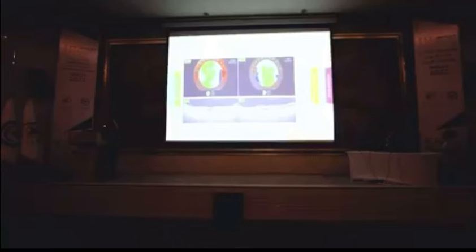This is one of our patients, a normal person. This is the mapping for choroidal thickness, and you can see there is a well-demarcated line between sclera and choroid. This is not manual drawing, this is automated drawing by the machine itself, and it can measure the thickness of the choroidal tissue. This is a normal person, and this is the normal thickness in the 9 areas of the macula.